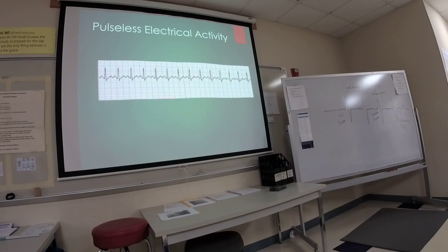So PEA, pulseless electrical activity. No pulse. Very good looking sinus tachycardia here. Like I said, usually it's going to be slower, but a very good sinus tachycardia, but no pulse. So how do you treat that? The same way they treat asystole: medication, epinephrine. You start CPR and they start administering epinephrine. They want that muscle to contract.